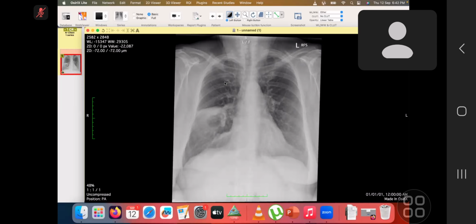If the patient did have infective symptoms, then it could represent a lung abscess. I haven't been provided with any information, but I would correlate with clinical history and inflammatory markers to check if there's any evidence of the patient being septic. Other less likely differentials for a solitary lesion would include a rheumatoid nodule or a cavitating lesion secondary to GPA, but these would be much less likely given it's solitary.